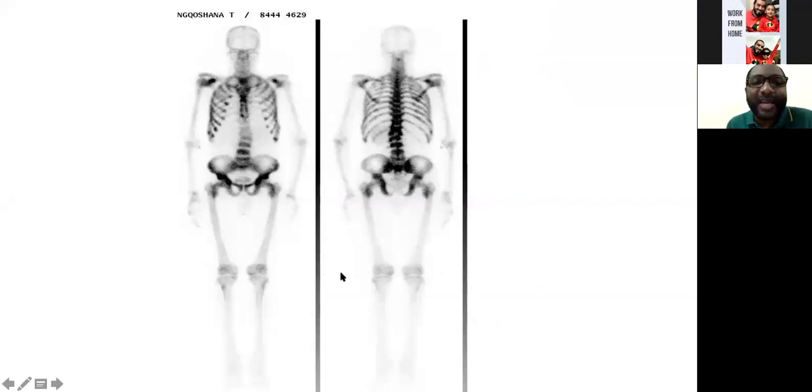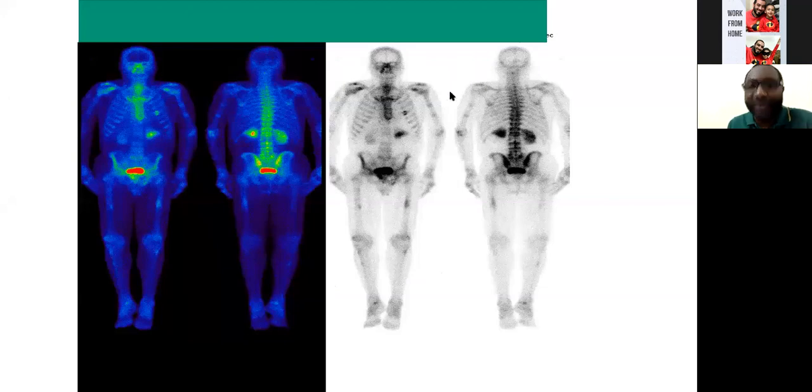Again, this is a Dr. Jawa, excuse me, I'm sorry, but there are some questions. I think some people are asking about the activity in the right kidney, and the non-visualization of the right upper forearm. So is this not a complete scan, or should we call it a superscan? Again, scan?